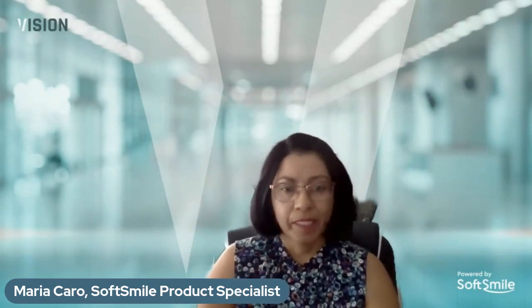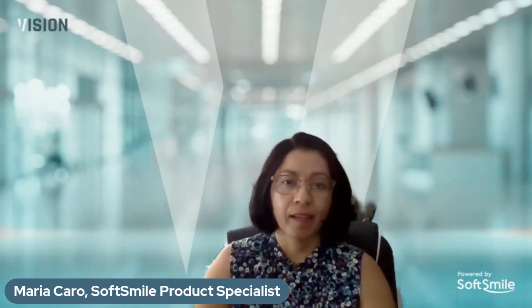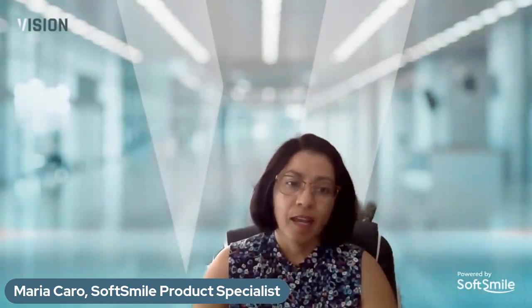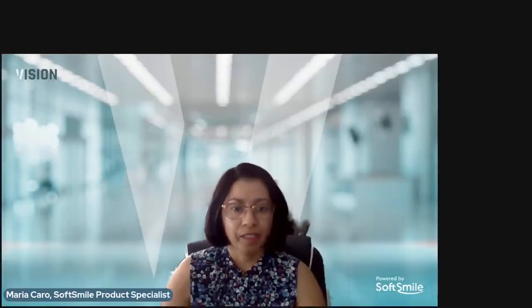Again, like Damien mentioned, my name is Maria Caro, and I will be presenting a case with a treatment plan that was shared by one of our founders, Dr. Islam Reslan, where he discusses how he uses CBCT integration in his practice. Now, you should be seeing the case momentarily on your screen.